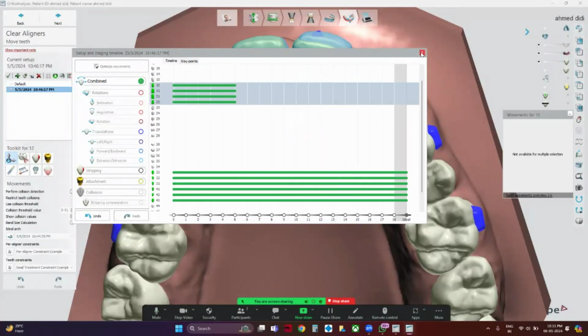So you can eventually decide that you can start the patient using the 5 aligners at the end of the treatment, or you can ask the patient. So 19 aligners is approximately how many months? 19 aligners, 4 4s are 16, 5 4s are 20. So that's about 4.5 months approximately.